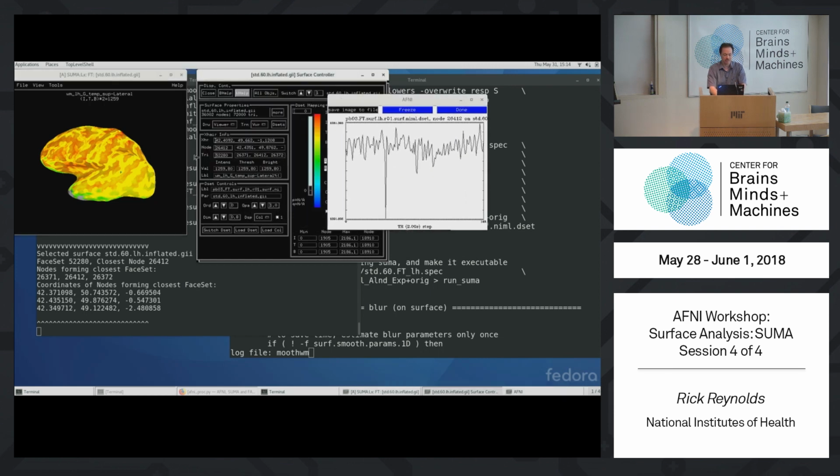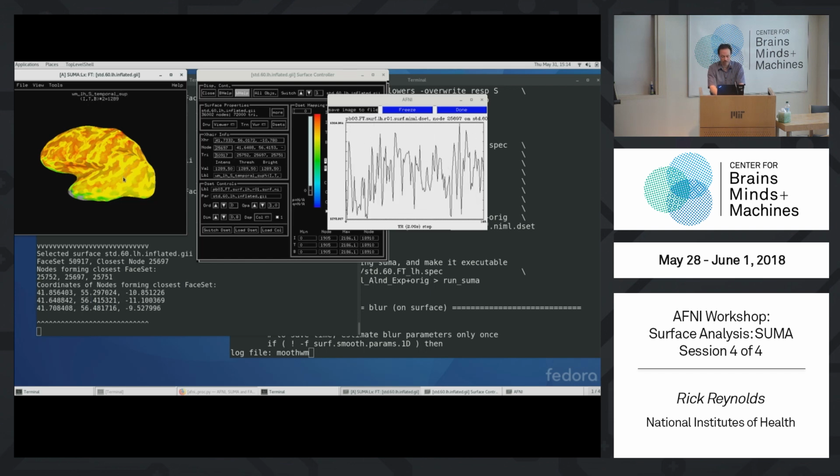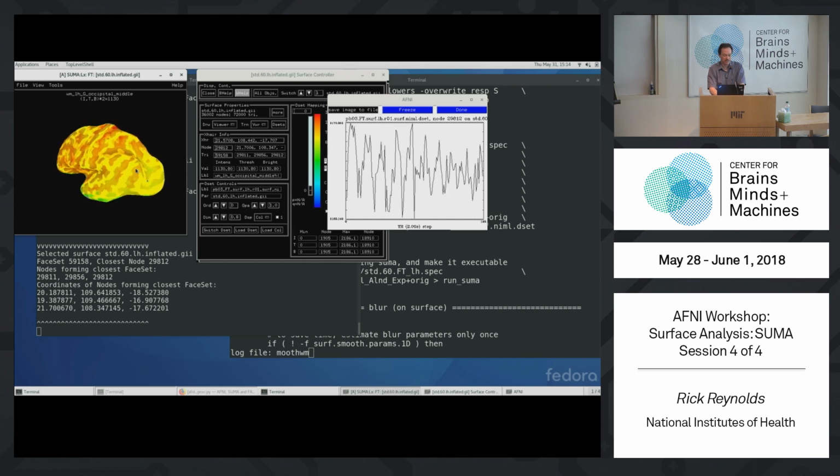There's a time series. Now let's be wild. I'm going to drag the mouse around while I right click. That's actually kind of quite cool. So you can go surfing around and look for your happy data locations. Oh, that looks beautiful, right? That's clearly something that's happening in response to our stimuli.